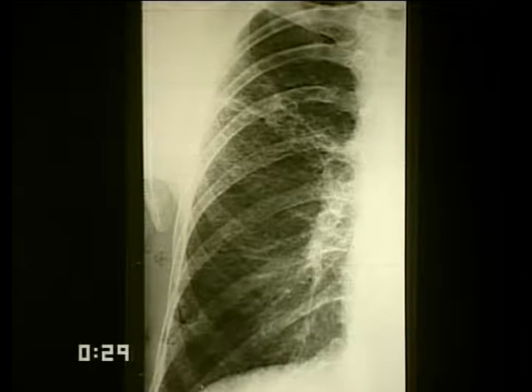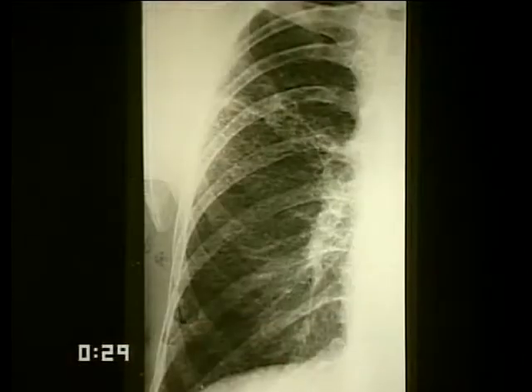Any interstitial disease that is associated with fibrosis, independent of exposure to cigarette smoke or no exposure to cigarette smoke, is a risk factor for cancer. Whenever you see anything that is slightly deviant, such as this scar-like abnormality here, lung cancer must be in your differential diagnosis. So in conclusion, the disease is common.